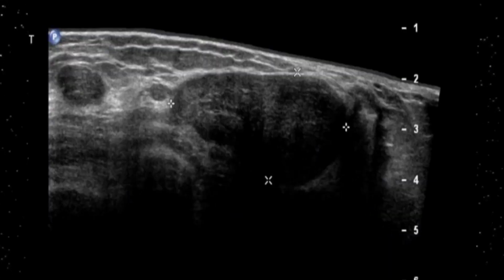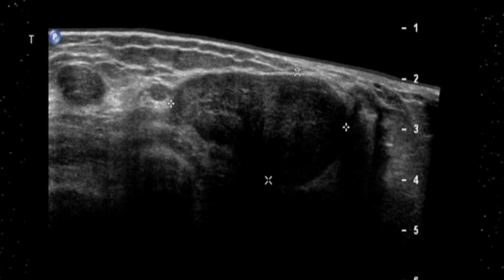Again, have a look at this lesion. It is multifocal, like there are two lesions in it. The smaller one is just developing, and the larger one is again showing the posterior effects. The attenuation from the lesion is absolutely obscuring the posterior margin, so you are unable to comment on the posterior margin of the lesion. So it makes it more favorable for a malignant lesion.